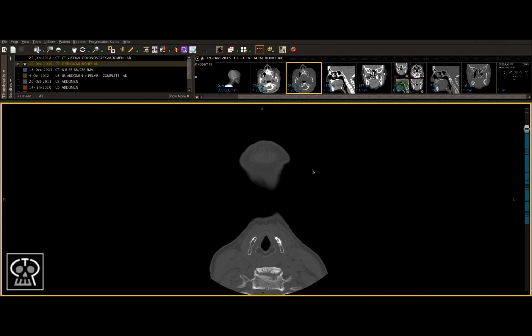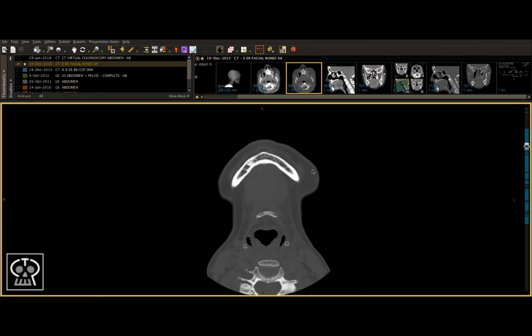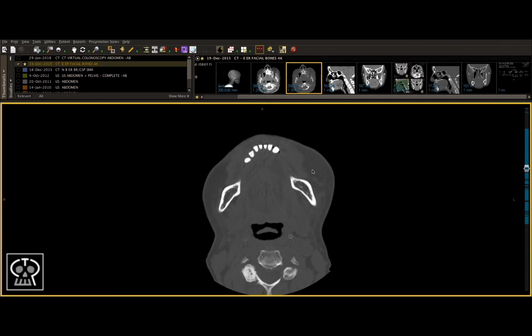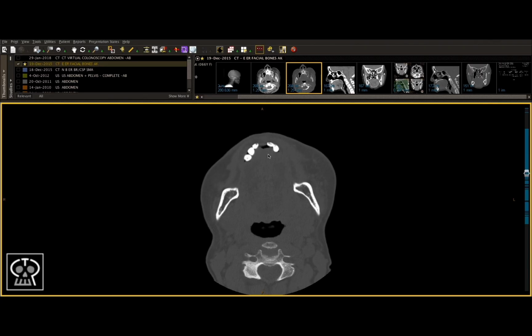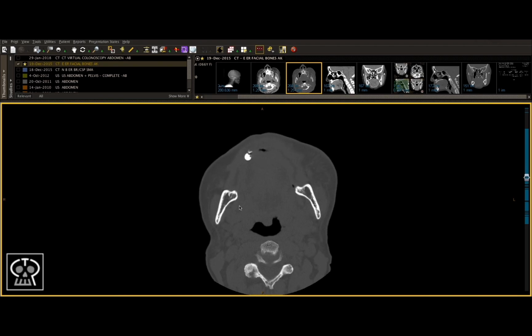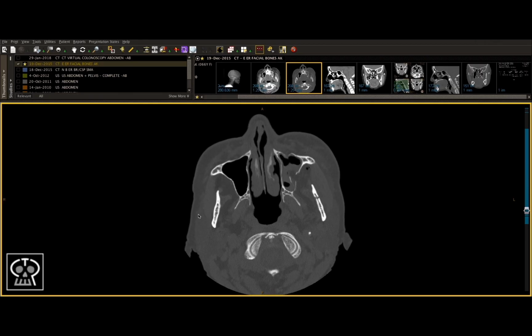Let's move on to another example of a fracture. Once again, I booted up my axial scan, and I'm scrolling through. At this point, I haven't seen anything, and I can see the junction between the mandible and the maxilla starting. So I'll decide to focus on the right side only, looking all the way back. And as I scroll through, once again, I don't see any obvious fractures as of yet.